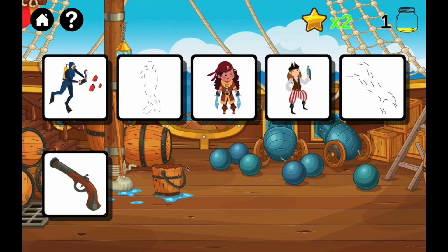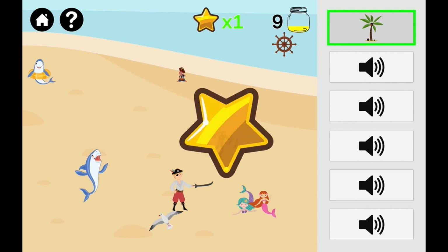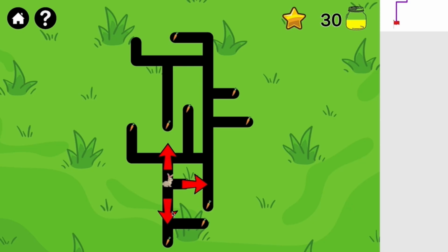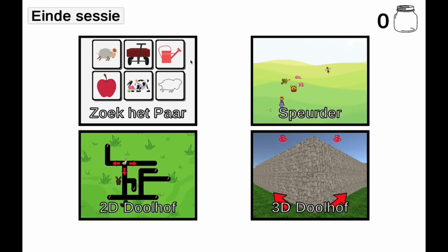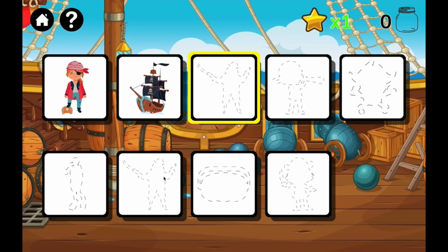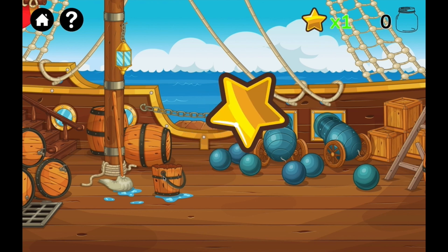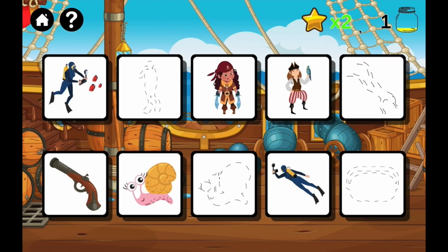What we're seeing here is the second iteration of the iVision prototype for children with cerebral visual impairment and inability to understand what they can see around them due to an issue that is related in the brain. In the second iteration, we made everything look a bit better for use in the study, and we also added additional reward mechanisms. The first mini game is the one where you have to form pairs of objects.